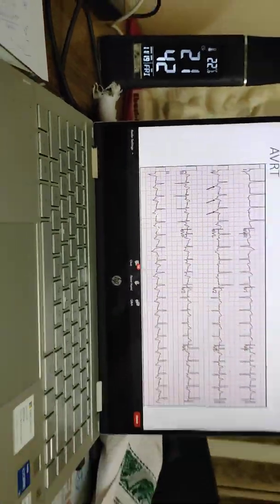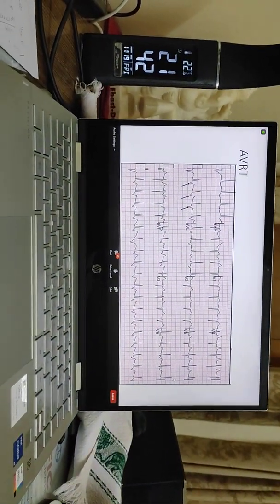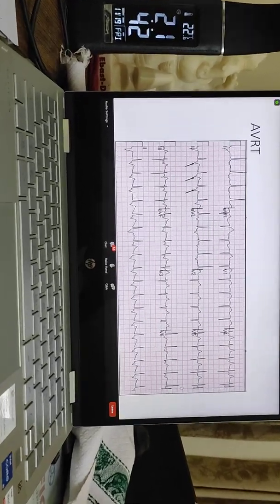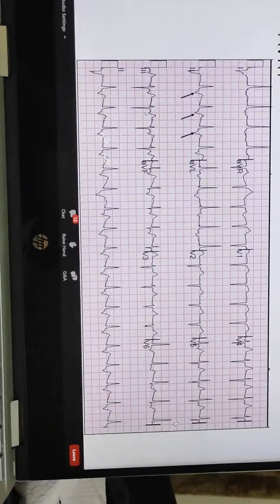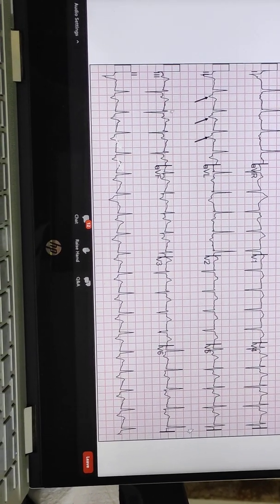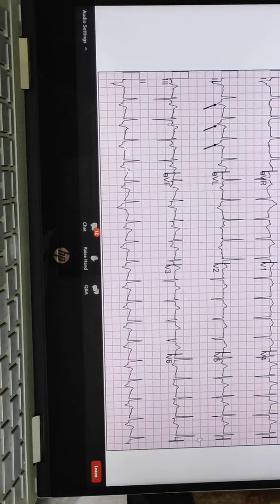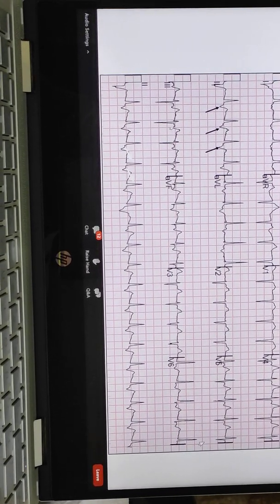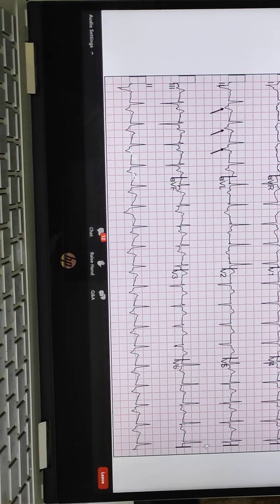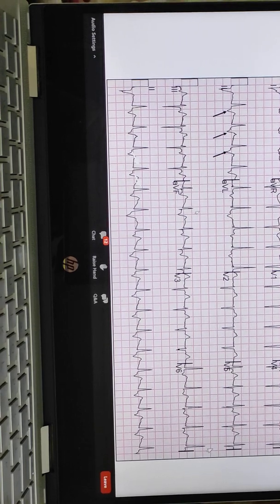Whenever this inverted P wave is a little beyond the QRS, I understand the antegrade ventricular activation is occurring early and the retrograde atrial activation is coming a little late, because it has to go retrogradely, reaching the accessory pathway and only then the atrium. So whenever this type of retrograde P wave appears a little after the QRS, with a slight delay from the QRS, during the tachycardia itself I know this tachycardia is due to underlying WPW syndrome.